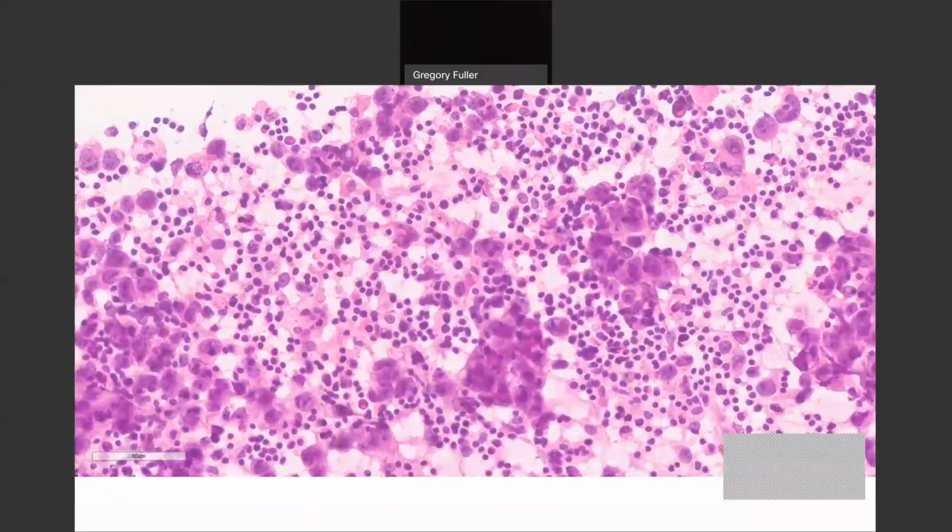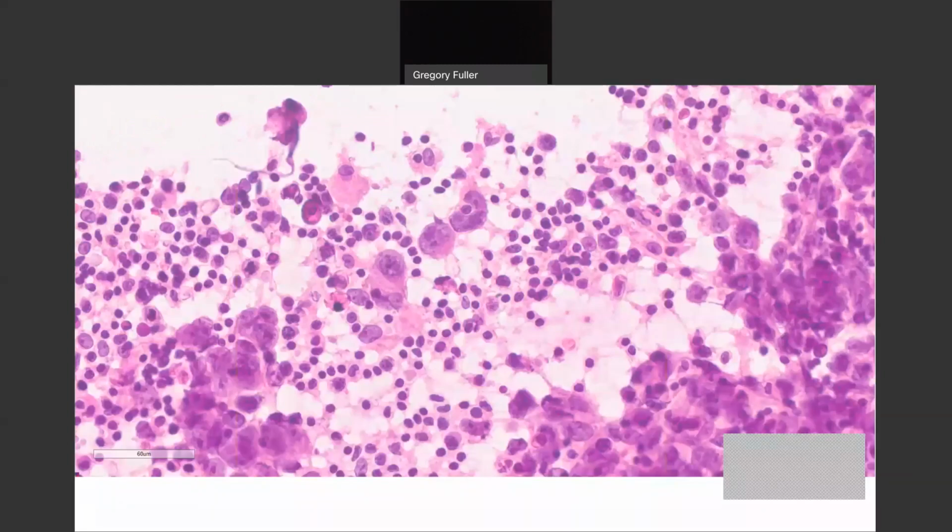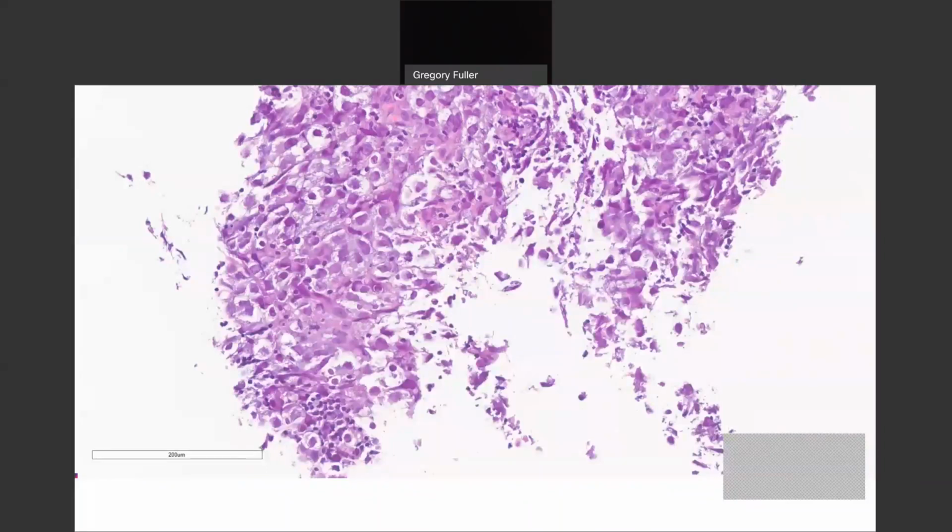Let's go up a little bit higher power. All right, what you're seeing is a biphasic pattern. Dr. Gilbert says this was a radiosensitive disease. Yes, absolutely. Highest power. All right, what you're looking at are reactive lymphocytes. Dr. Harb got it, nailed it, excellent. Reactive lymphocytes in these large, ugly-looking tumor cells, biphasic distribution. All right, here's the tissue section. Honestly, which do you like better? Don't you like the smear better?